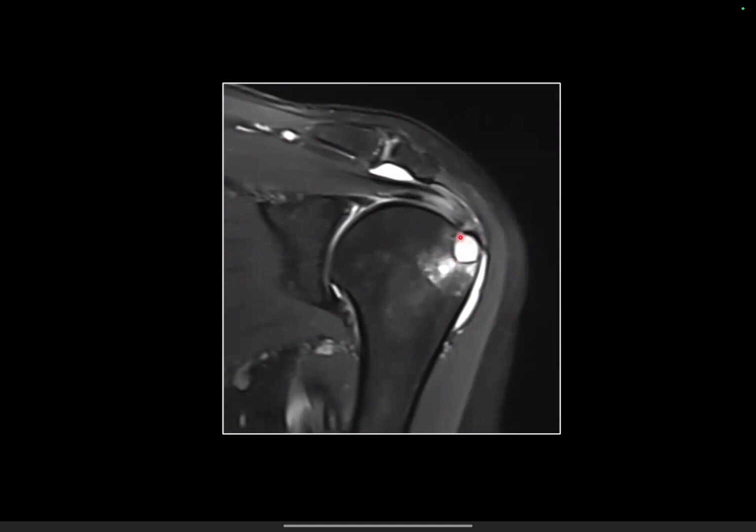Whenever you see any cortical cyst at the attachment site of the tendon, you should mention the cyst measurement, and mention the cyst in the impression also, because when they fix a supraspinatus tendon tear or any cuff tear, the screw will not get enough bone to fix, and it will result in a re-tear. So whenever you see any cyst at the footprint attachment of the supraspinatus or any cuff tendon, you should mention it in the report.